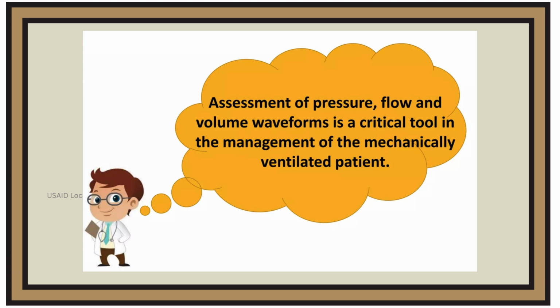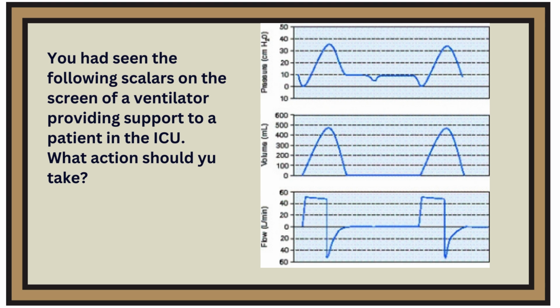Assessment of pressure, flow, and volume waveforms is a critical tool in the management of the mechanically ventilated patient. When you see the following scalars, what action should you take?